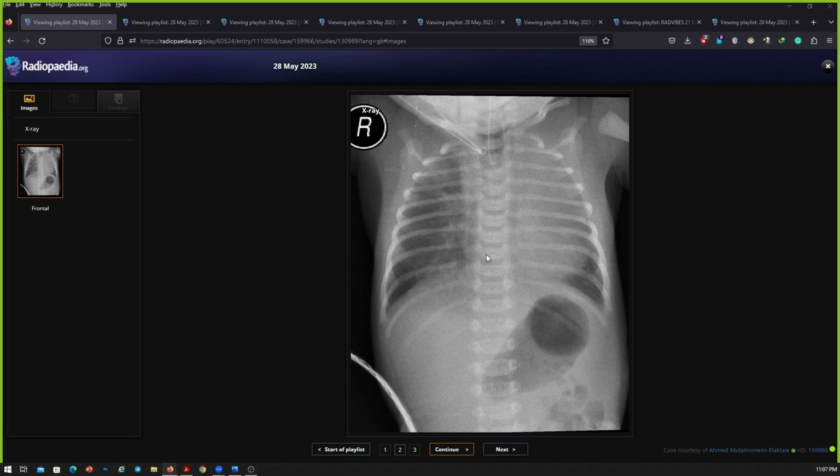Okay, and regarding the cardiac anomalies that might be associated with this entity, which are the cardiac anomalies that you would be worried about? So it can constitute the septum primum defects, it can be ASDs, and it can also be VSDs, mostly septal abnormalities. Okay. So you told me that this is a case of esophageal atresia with a tracheoesophageal fistula, right? Yes. How do you differentiate this particular case from an isolated esophageal atresia? So the presence of gas distension of the stomach as well as gas distended bowel loops that are appreciated will help me to differentiate between esophageal atresia and an associated tracheoesophageal fistula.